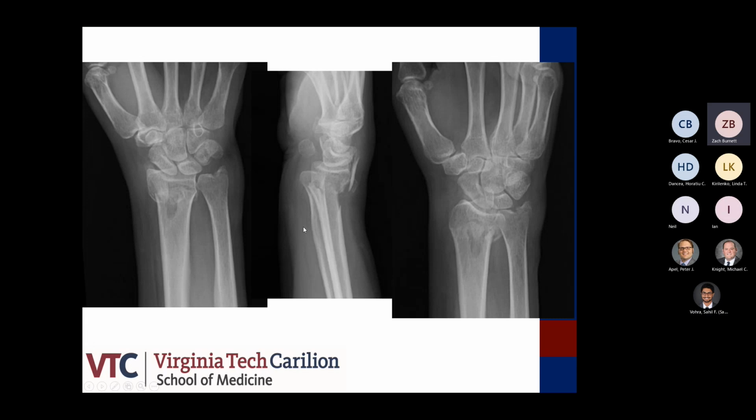She's 56. I mean, definitely concerned that it won't. There's some dorsal comminution, loss of volar tilt. She's 56, and questionable shortening of the bone, more than 3 millimeters. There's an ulnar styloid fracture associated with it, so certainly high risk for displacement. But I'd like to see what it looked like after a reduction. Okay.